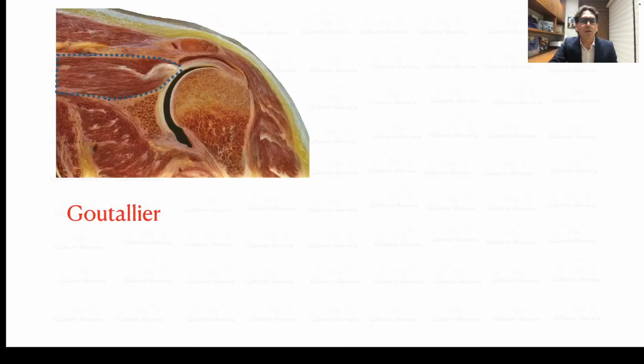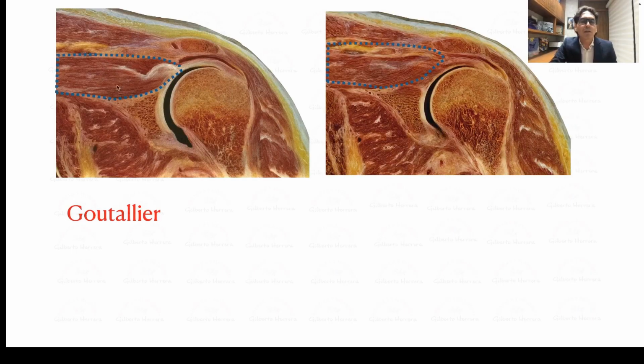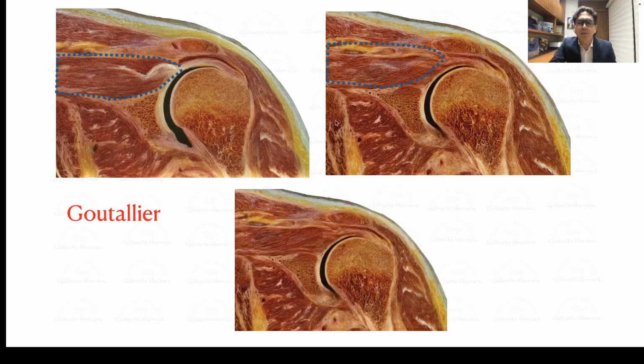So if we start from the knowledge of the anatomical specimen, we see that in a normal stage, there is a central tendon and a muscle with healthy or normal characteristics. In stage 1 then, notice that the pattern, we've tried to simulate it here, starts to fade, and the muscle, which is already more atrophic, also begins to lose its characteristics compared to the others. Here, it's already more atrophic, and there is no longer any intramuscular tendon. So basically, 0 is normal, 1 is partial loss or sparing of the tendon, and stage 2, there is no tendon. The pattern is no longer visible.